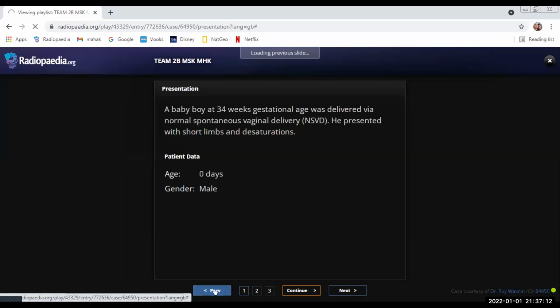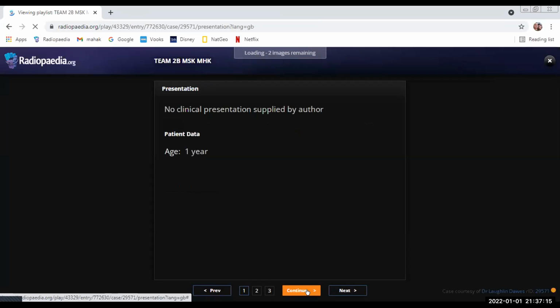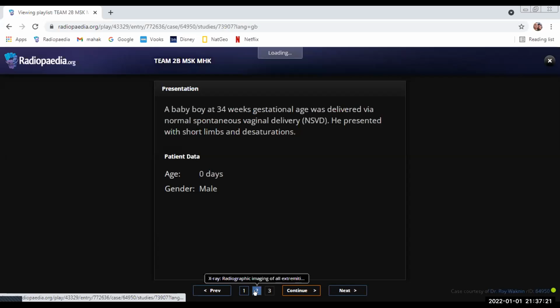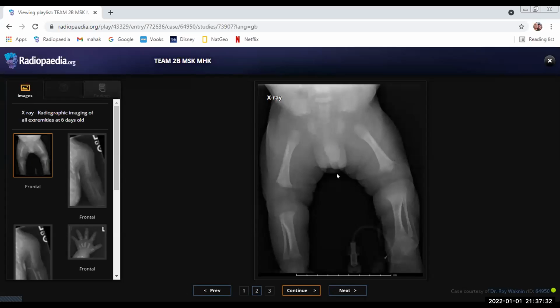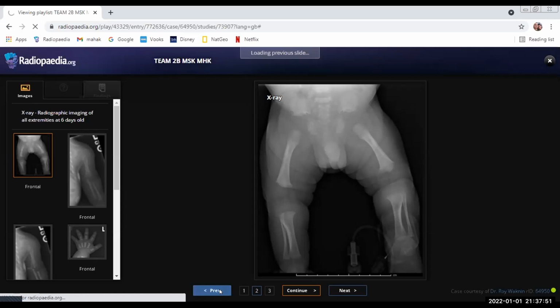Yeah, this was achondroplasia. Just a minute. So in this case, there was rhizomelic dwarfism, and you described all the findings very well. There was widening and metaphyseal irregularities, and they are like the clowns we mostly see in circus, so they are stubby. So increased skin folds. Always look at the soft tissue and skin along with the bones. So this was a takeaway message. Right. Okay.